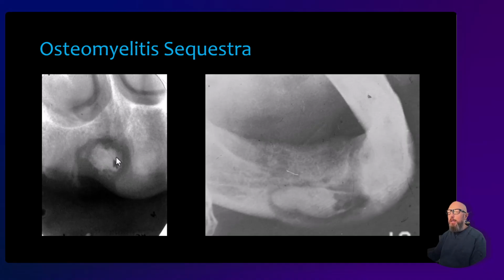Same thing right here. Just looking at this, it looks like it could be a residual cemento-osseous dysplasia. This one, hopefully you wouldn't think that because where's the tooth-bearing area? Here's the alveolar bone up here. Osseous dysplasia should be above the canal. This looks more like it's in the non-odontogenic region, so don't start thinking odontogenic things.